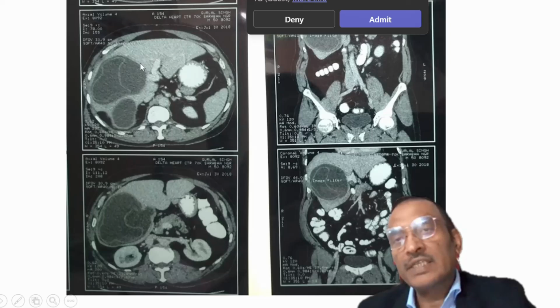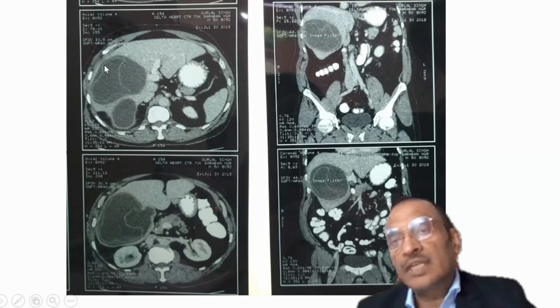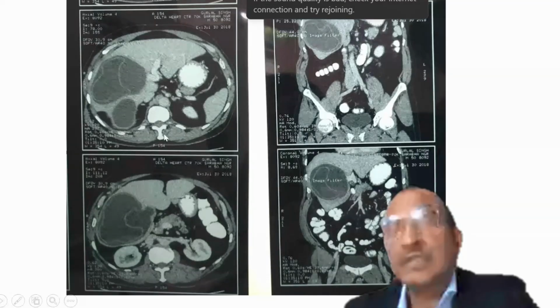So what you are seeing here is large cystic lesion and mostly detached membrane which seem to fit in. So again for differential hydatid cyst, and I told you that we always look biliary. So here we see that there is no intrahepatic duct dilatation. The bile duct doesn't seem to be dilated out here. So there is no overt evidence of rupture. So that we will try to see.